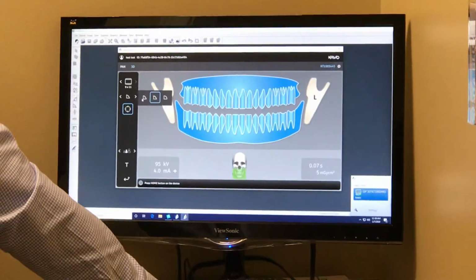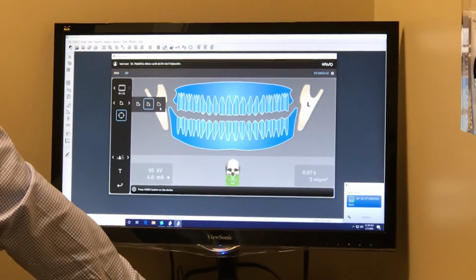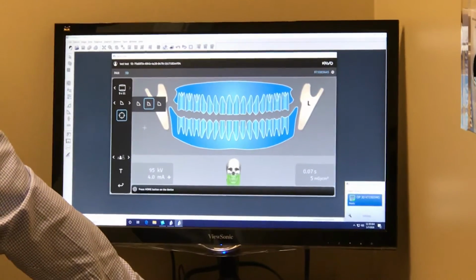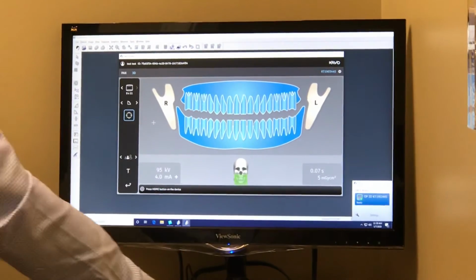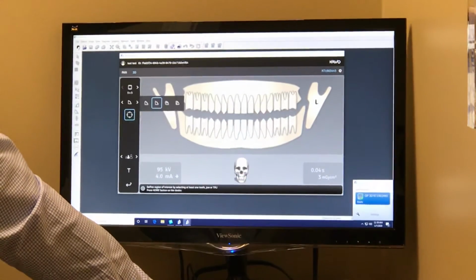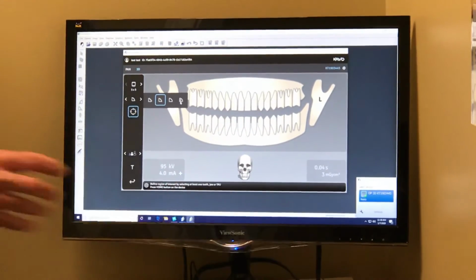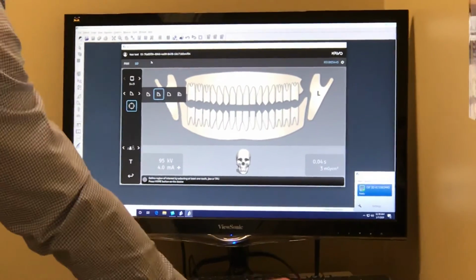You can select those. Starting from the left, you have your low dose. Going to the right, you have your high res. Where's the endo res, to the left or the right? It'll be all the way to the right. If I pick that small field of view, you'll have a little E in that scan. A little icon.